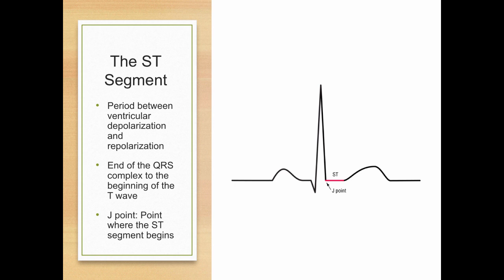And we're going to call the end of the QRS the J point. I don't know why they pick that. I didn't pick that. Why J? I don't know. Don't ask me. Please don't ask me. It's called the J point.